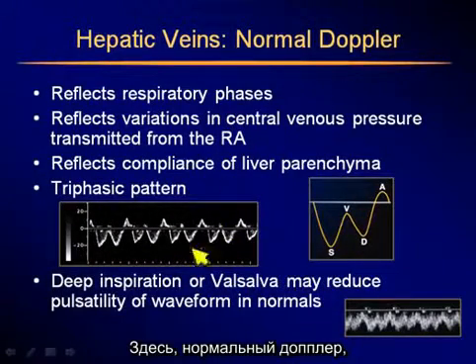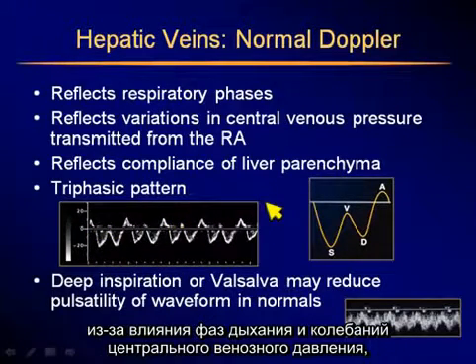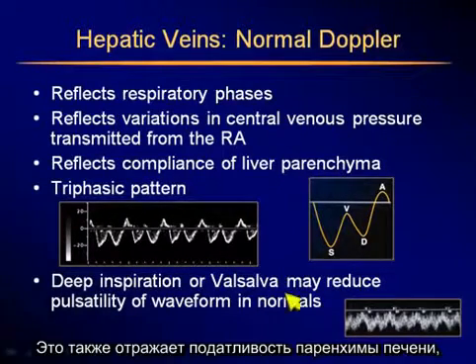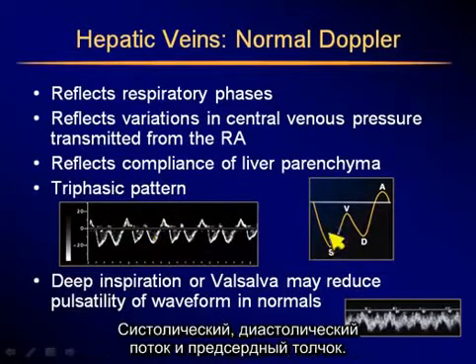The normal Doppler here, the reason for this pulsatility is because it reflects respiratory phases and variations in central venous pressure that is transmitted from the right atrium. It also reflects the compliance of the liver parenchyma, giving us this triphasic waveform, systole, diastole, kick.